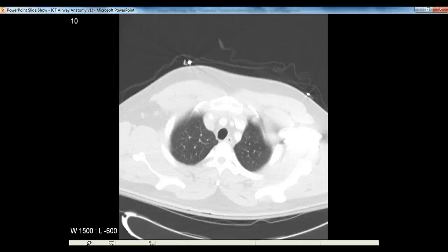But you can see that the trachea itself is still horseshoe shaped, and the vertebral column is also, this is the middle of your back. So you push on your back, look at how much distance there is between the skin and the bones. You may feel like you're pushing on the bones, but you're not. You're a long way from them.